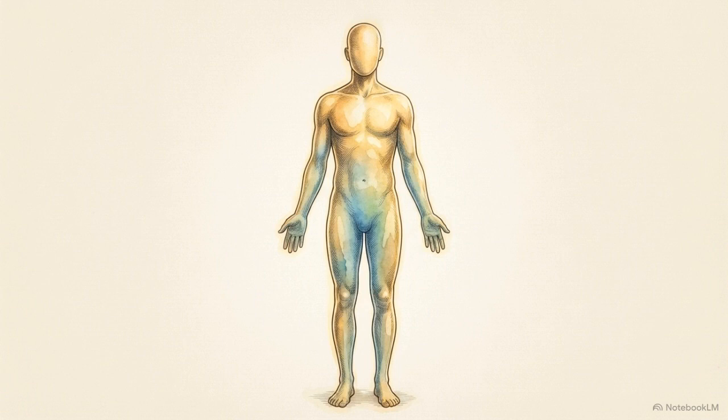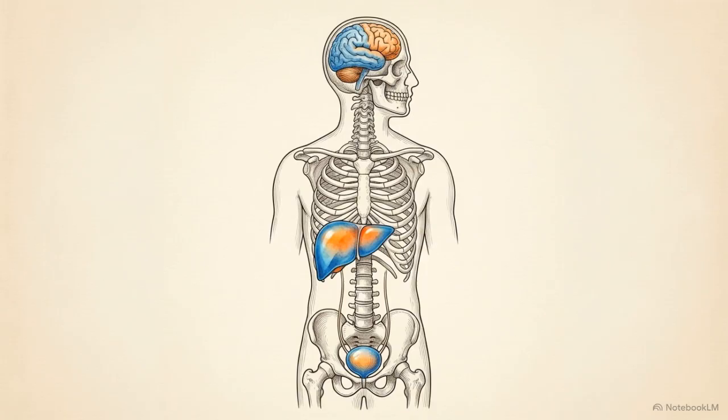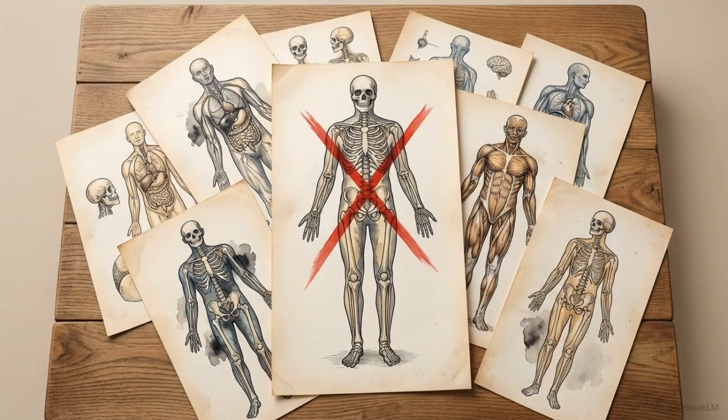You are presented with a blank slate, an unlabeled, full-body nuclear medicine scan. The strict objective in this clinical scenario is to systematically deduce the exact radiopharmaceutical used, relying entirely on biodistribution patterns. Trying to memorize the macroscopic shape of these scans is a failing strategy. There is simply too much visual overlap between different radioactive isotopes to rely on pattern recognition alone.